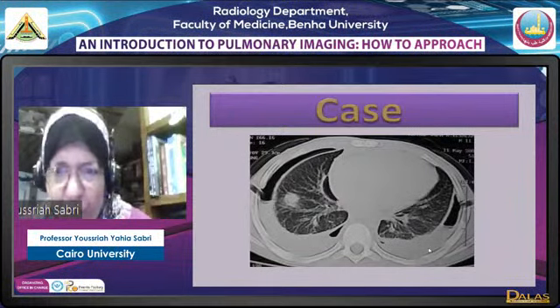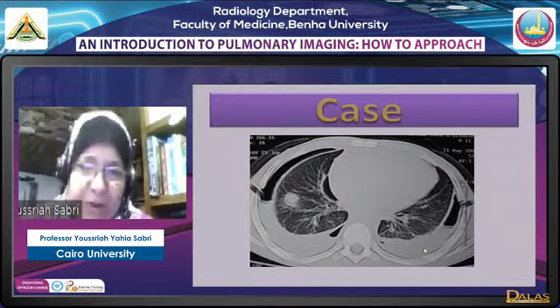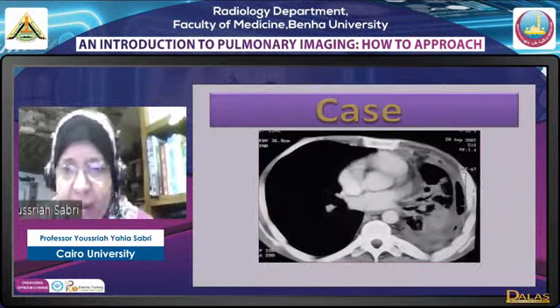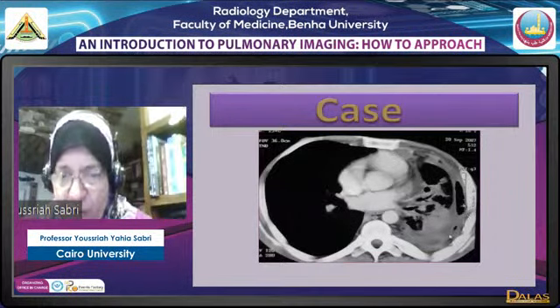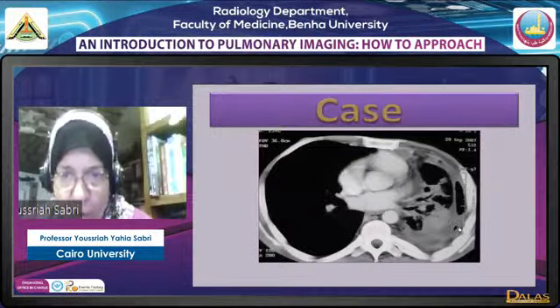As I said before, if we see a loculated hydropneumothorax related to an inflammatory lesion, we have to consider a bronchopleural fistula, especially if there is no tube put. Here we have a bronchopleural fistula. There is marked pneumonia, complicated, and a loculated hydropneumothorax without a tube. This is a fistula, bronchopleural fistula.